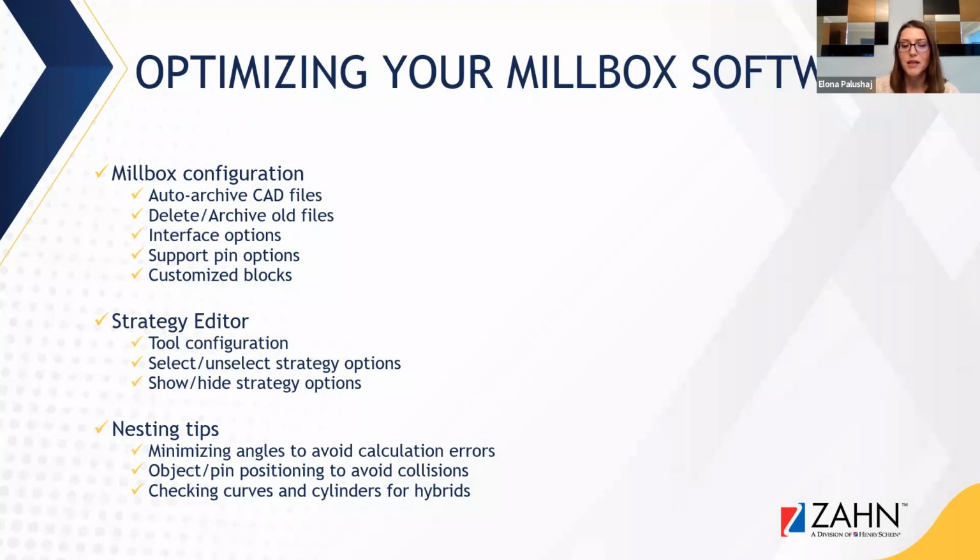We'll start with covering some of the MillBox configurations. There's a few features that I think are underrated that have been there for a while, and I hope you can find use for them in your software.